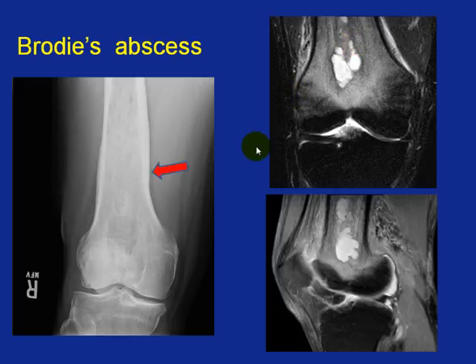Don't want to call this tumor, but this may be hard to distinguish from other entities, so it may require biopsy.